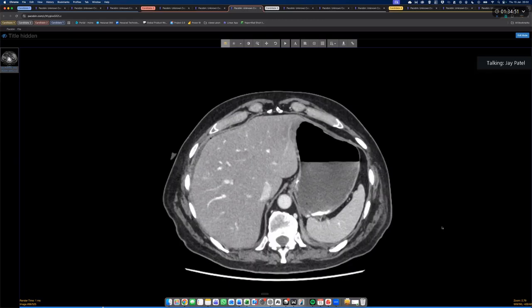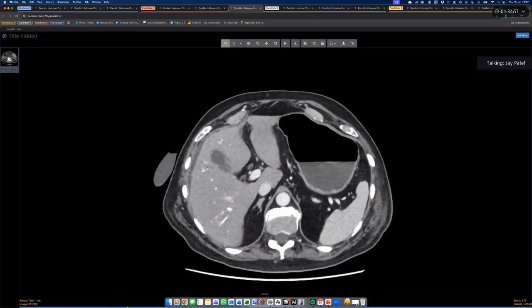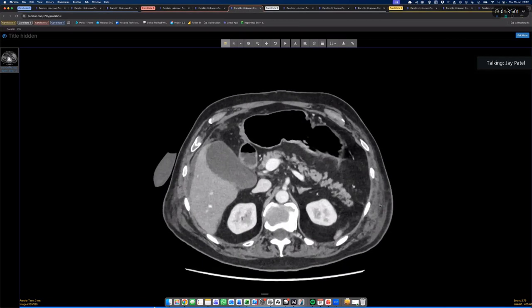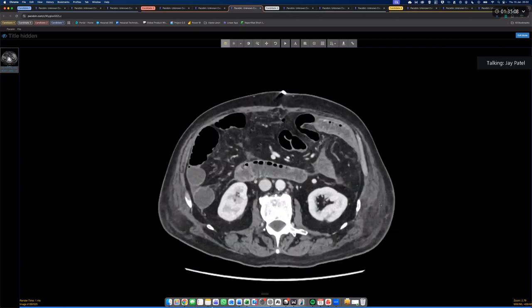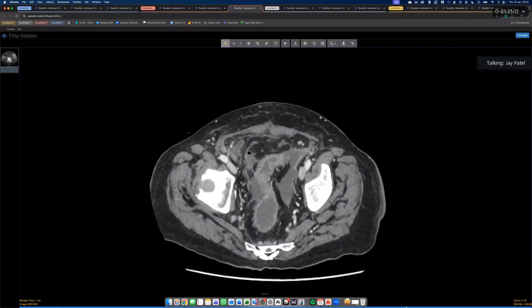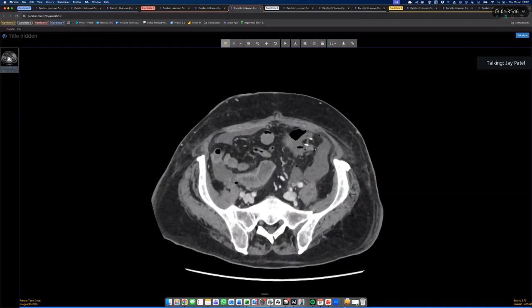But that makes me, as a GI radiologist, immediately question what's going on. The next thing I would say, as a really critical thing to do, is always understand what surgery the patient's had. So you did something that one of my old registrars did for this case, which is they said that this was a sigmoid anastomosis.